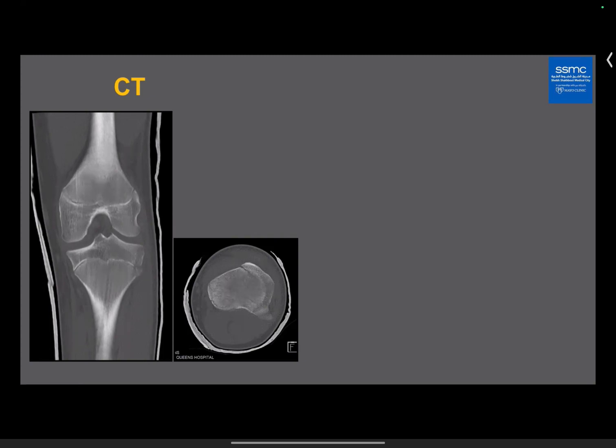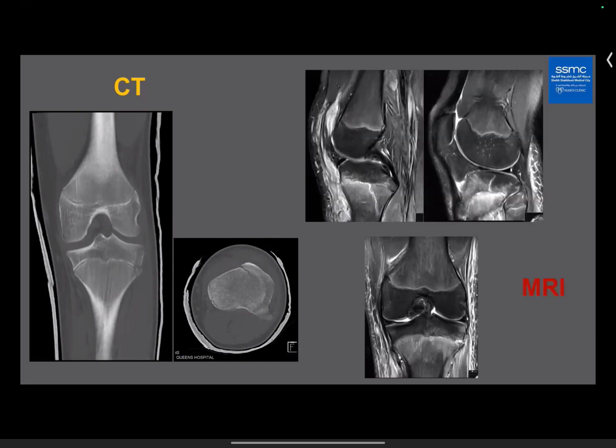And the clinician was worried that there is much more going on in the knee in this child, because he was not weight bearing or not behaving as expected. And then we did an MR, and you can see, lo and behold, he's got a Salter-Harris type 4 fracture. It goes through the epiphyses, through the metaphyses across there. So sometimes you have to do everything, and then the buck stops at the MR, because MR has the capability of delineating the bony injury much better than CT.